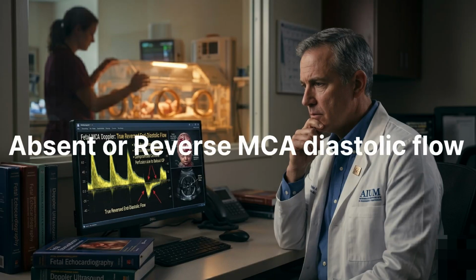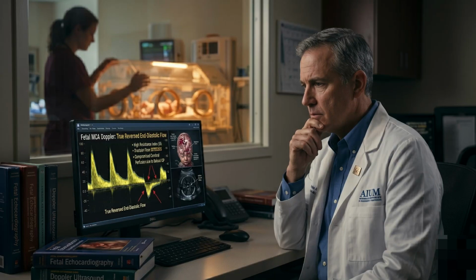Today I will discuss absent or reverse MCA diastolic flow.